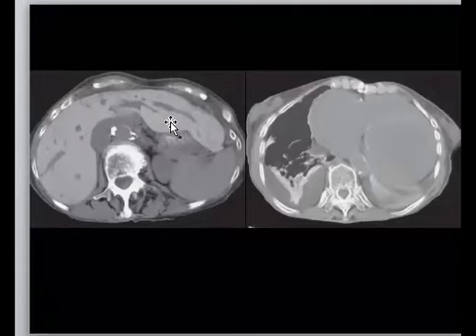This was amiodarone therapy, and you imagine that in the lung there will also be involvement, right? So what happened here? Heart failure, enlarged heart, perfect. And this patient took amiodarone for treatment, and he developed what is characteristic for the consolidation also here.